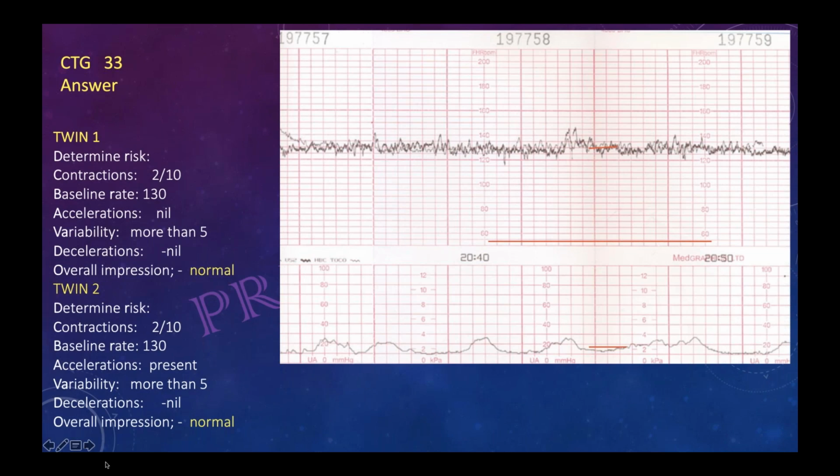But ma'am, in the middle of the trace, near the red line in the CTG tracing, isn't there a kind of acceleration, because it rises about 20 beats per minute for more than 50 seconds? Can it be regarded as an acceleration? One box is 5 beats, I think.